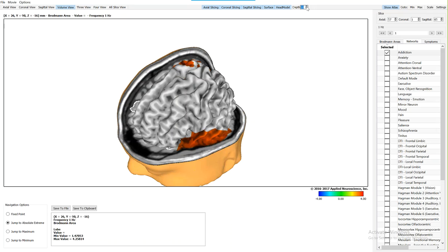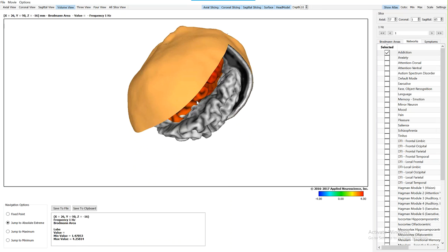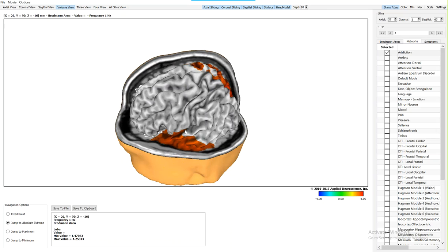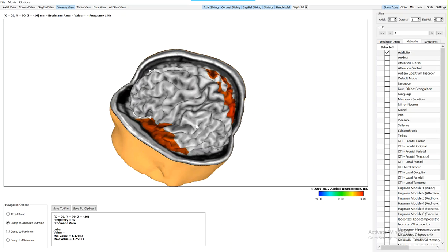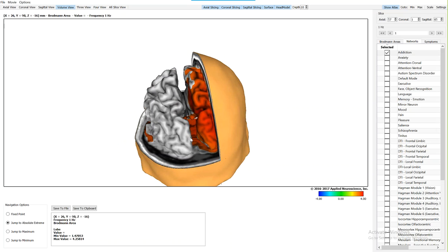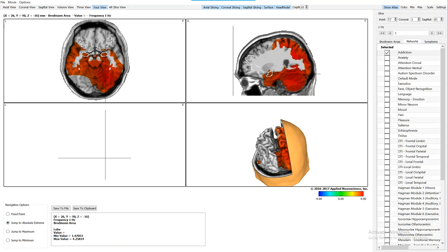And then we can go down into the depth again and look at z-scores at the deeper surface of the cortex, as well as at the upper surface of the cortex. That's one of the advantages, as I mentioned, for the weighting that's available with swLORETA, because of the ability to create a homogeneous lead field in the inverse solution of Loretta.